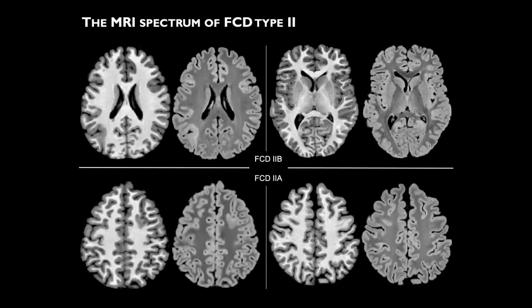As discussed in the lecture on visual diagnostics, FCD can be seen on MRI. Both FCD Type IIb and Type IIa generally present with increased cortical thickening, blurring of the gray-white transition, and intensity changes best seen on FLAIR, as shown in these two cases.